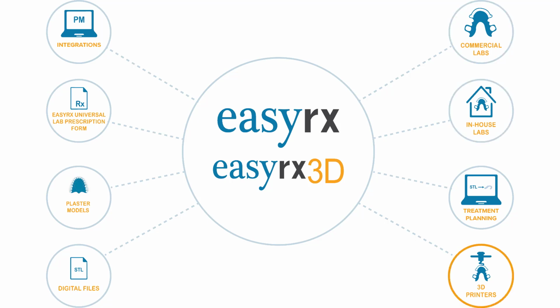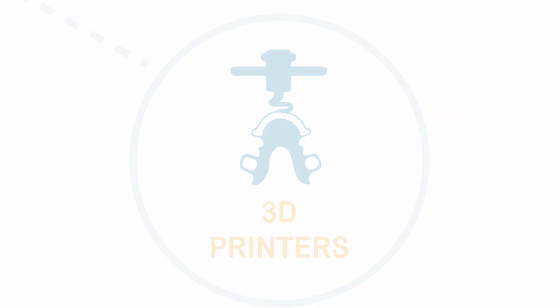In this video, we're going to walk you through EasyRx 3D, show you how to trim and base a model, preparing it for 3D printing. We'll also show you EasyRx 3D bracket removal to digitally remove brackets from models. So let's take a look.